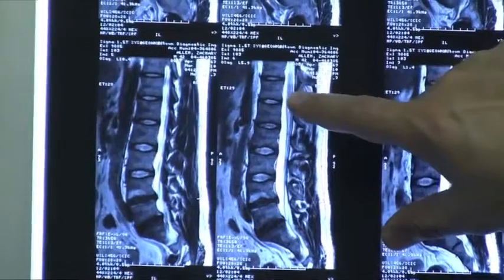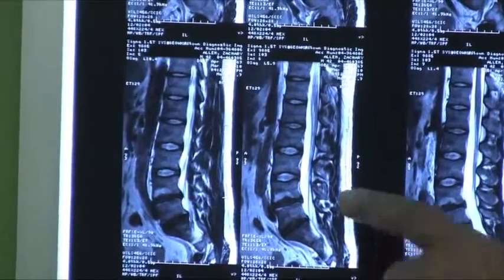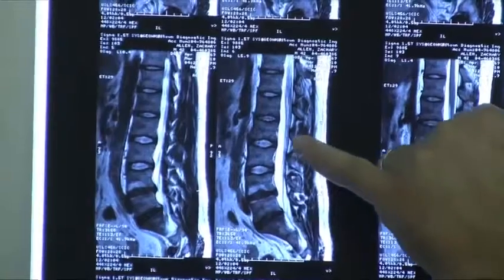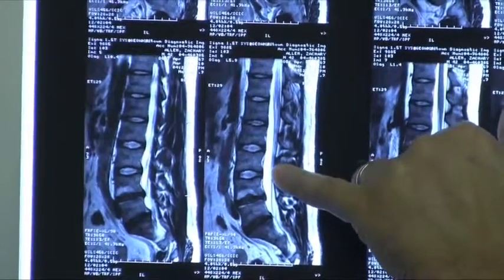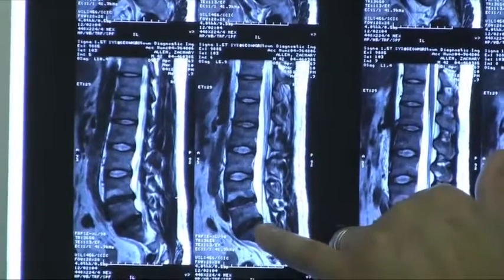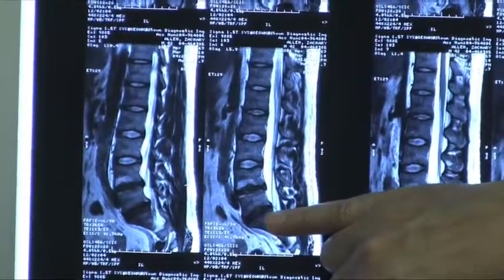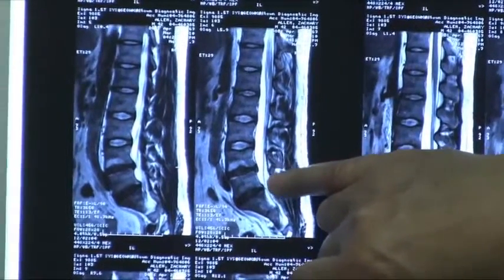In any case, if you look at these discs and vertebrae again, you can see that in this case, the person has good white discs there, there, and there. These have good water content. They're also not sticking out into the canal here, so they're not bulging or herniated. If you look at the one below, this disc and this disc are quite dark. It so happens that they've also lost some height, although not severely so. And they're sticking out a little bit in the back there and there in this particular image.